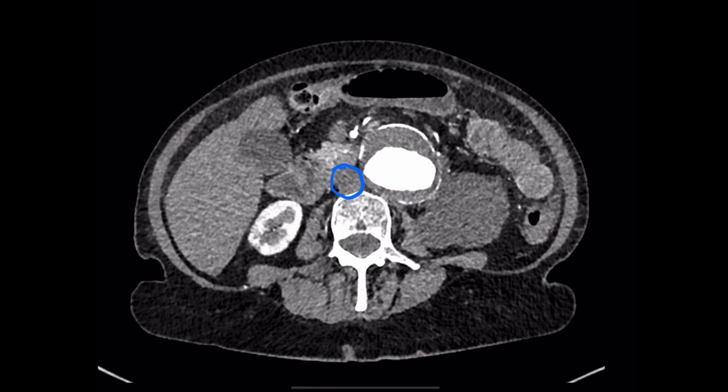But the ring of white stuff is different, is it? Or is it still contrast? No, in this particular case there's an aneurysm here. We have the white contrast of the lumen where the blood is flowing through. We've got the outer wall of the aorta, which is very heavily calcified and pathological. And in fact, this is all thrombus between the true outer wall and the inner lumen. So this is an aortic aneurysm with thrombus.